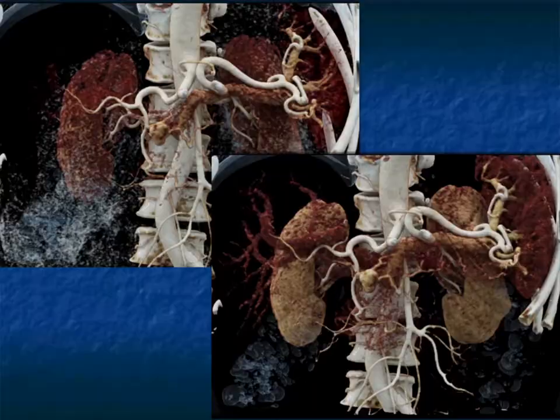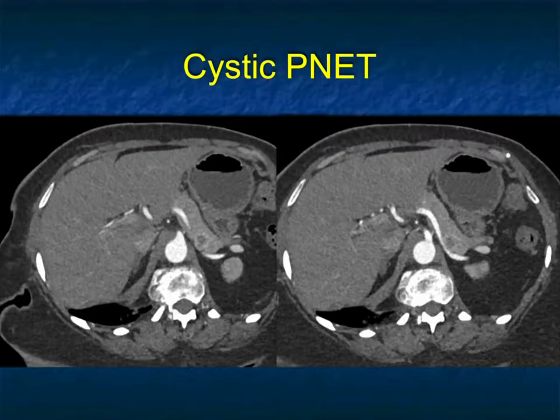And multiple images are generated. I mentioned that I'm coming up with some new rendering techniques. This is for optimizing the detail of the vessel. Look at this 3D render here. There's the GDA. There's the tumor. There are the vessels. Look how sharply you can see the edges of the vessels. I think it's very exciting.